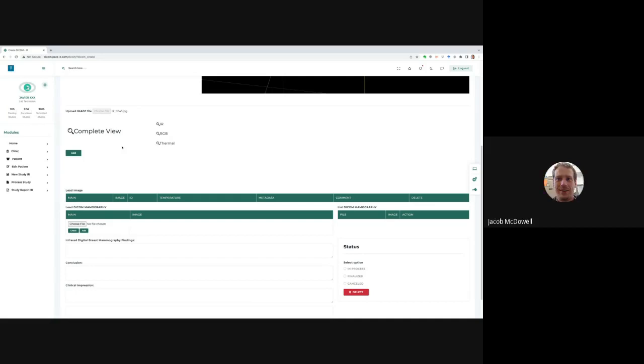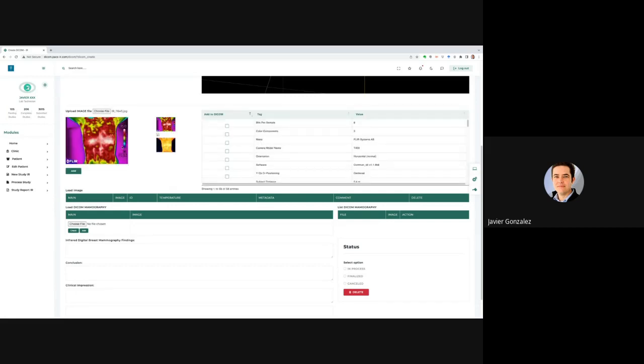So this would have been, obviously, the information taken from out of the camera. Yes. This is from a FLIR. This is a FLIR JPEG file. We already have the... here it is. So this is the file, and this is the metadata that is inside the file.